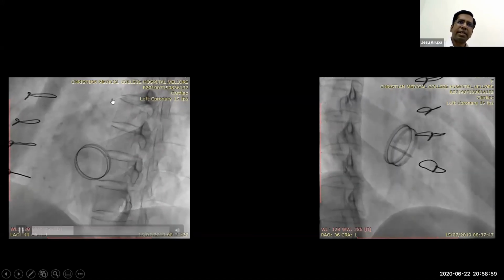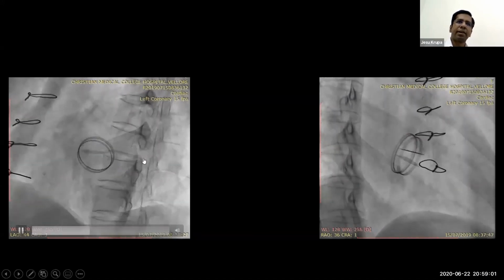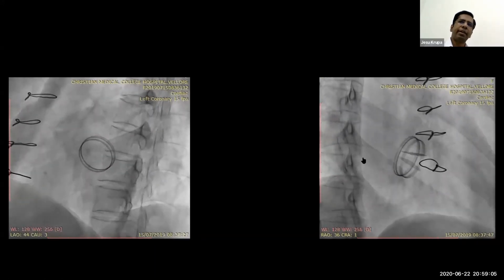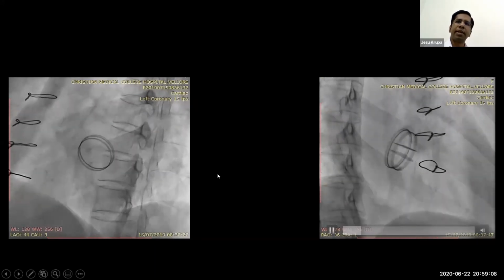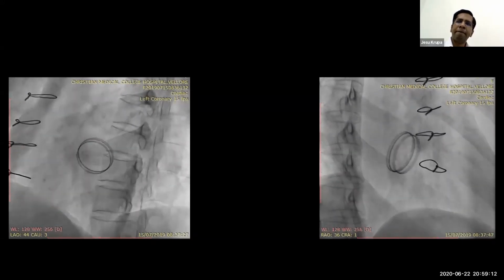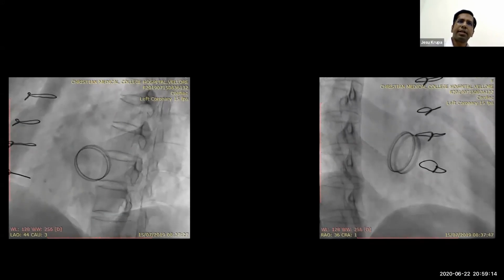So if you show this particular image, then you can wrongly conclude that obstruction is the cause of the high gradient. And hence the importance of even doing a simple fluoroscopy and doing it properly so that you are able to see the disc clearly.